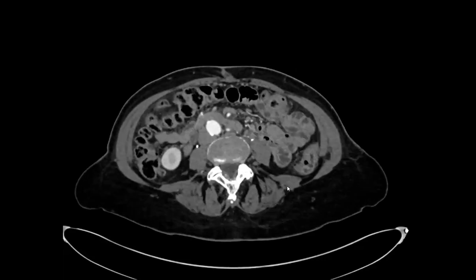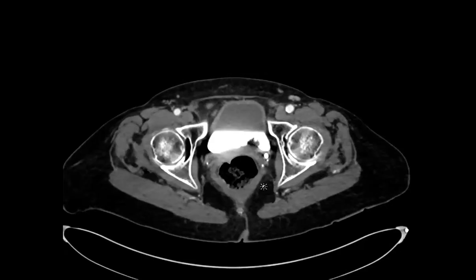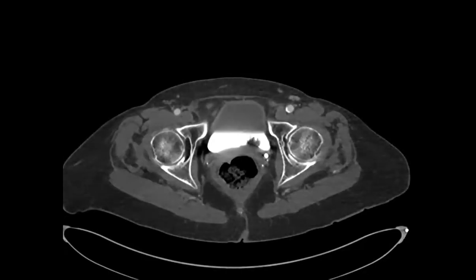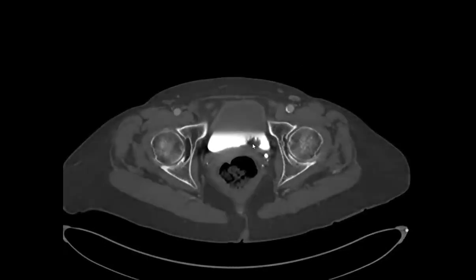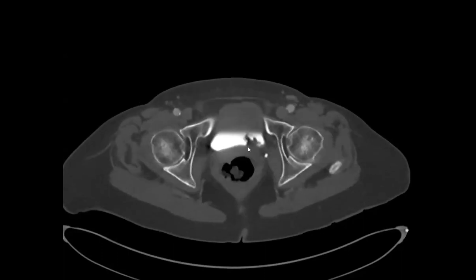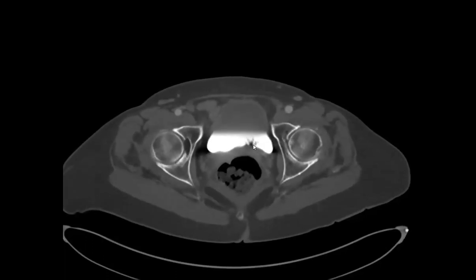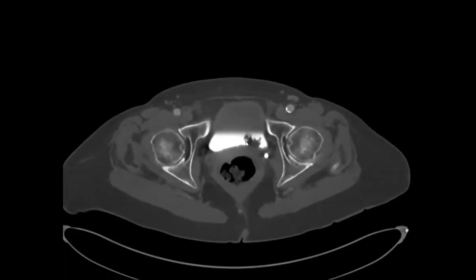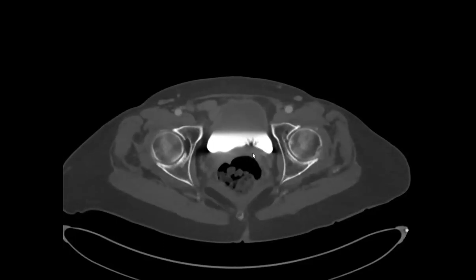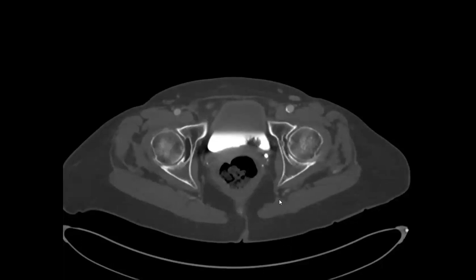Okay, so we have one cause for hematuria, and then, cute finding, we have another cause here. If you want to get rid of this kind of layering, you can have the patient do a log roll. Luckily in this case, we could see the filling defect without the log roll, but it could have been missed. We can see this big frond-like lesion in the bladder. This was resected, a transurethral resection of the bladder tumor, and it turned out to be a low-grade papillary urothelial cancer. They were able to get the muscle, and there was no muscle invasion.